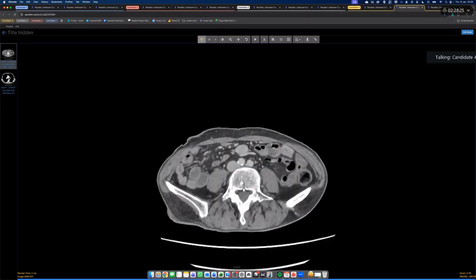Okay, so there's an enhancing lesion within the mesentery and an enhancing lesion within the small bowel loop. Given the significant enhancement, the differential could be carcinoid, which is present in the bowel loop and also in the mesentery. Another differential could be a metastasis if the patient has any previous malignancy. Small bowel GIST can be a possibility, but the lesion in the mesentery is least likely. So I will convey my findings to the referring physician.